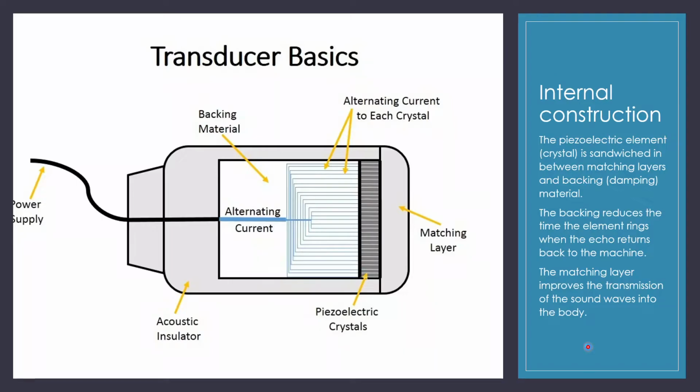Okay, it's important to know the internal construction of our probes. Again, the power supply comes in from the wire, it hits all of the different little crystals, and then the sound goes out, returns back, and goes back through that wire.